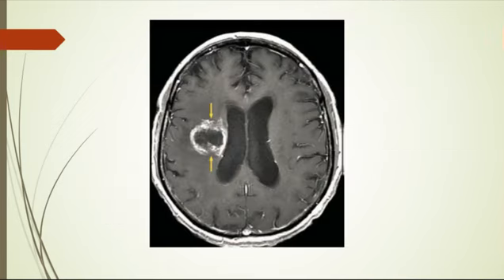Good. Now, what's this? How do you describe it? Ring enhancing, thick walled, ring enhancing, heterogeneous lesion, showing what's called a feathery or soap bubble or Swiss cheese appearance. Okay? What does this indicate? What do you think this kind of appearance indicates?